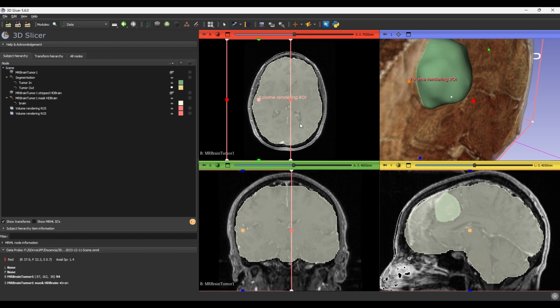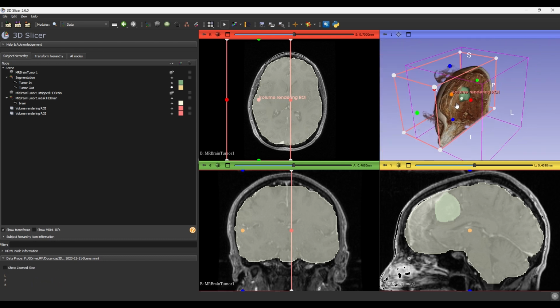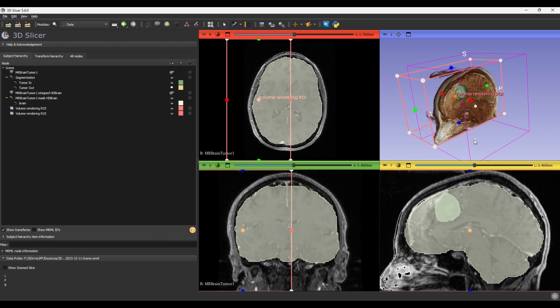This chapter is oriented to test more segmentation methods. In previous chapters, we have segmented soft tissues, brain and tumor. Now, to finish with the complete segmentation, we will segment the skull. To initialize, reopen the Slicer scene from the last tutorial session. Occlude all data except the original volume named MR Brain Tumor 1.